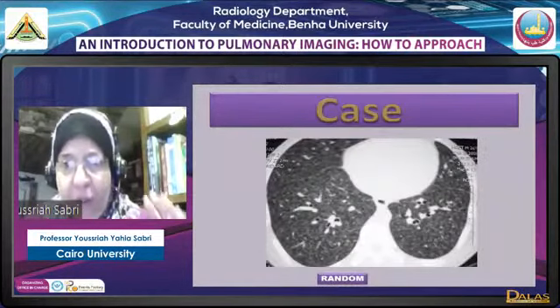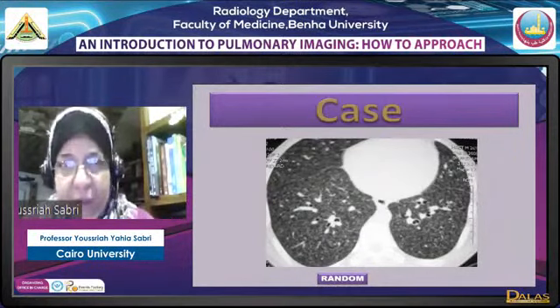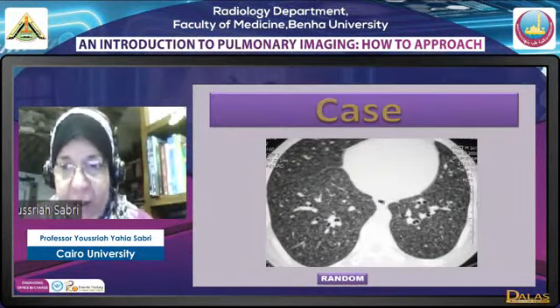This is random, this is miliary, this is a 26-year-old male, and the miliary pattern differential diagnosis is extremely wide, as we used to take in the third year of college. All that end with osis is miliary: sarcoidosis, tuberculosis, pneumoconiosis, etc.